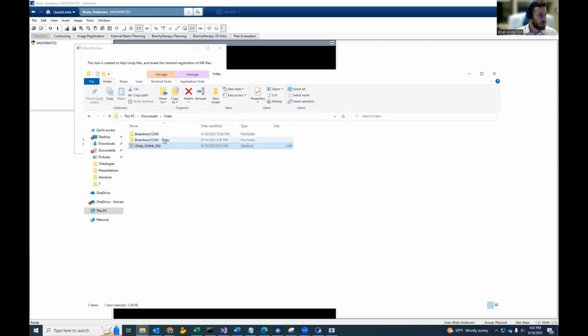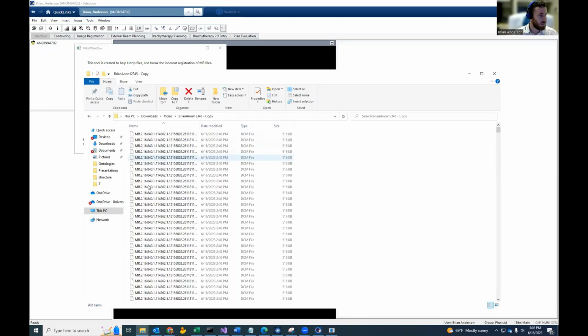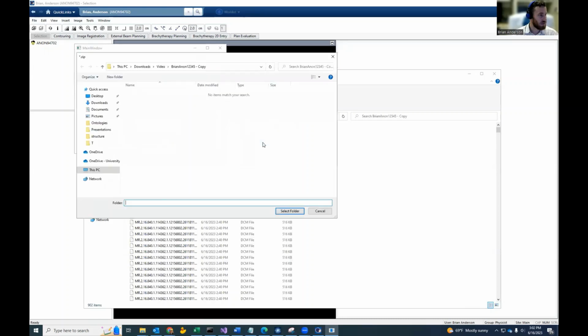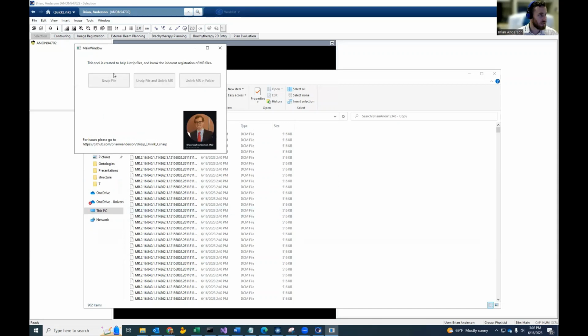So for this video, I already anonymized these patients, and then this is just a copy of the files that I'm going to anonymize or unlink. So click unlink MR folder. It's already here. Select that. And now essentially what it's doing is it is going to read through all these files and group them because they're currently just kind of all clumped in together.